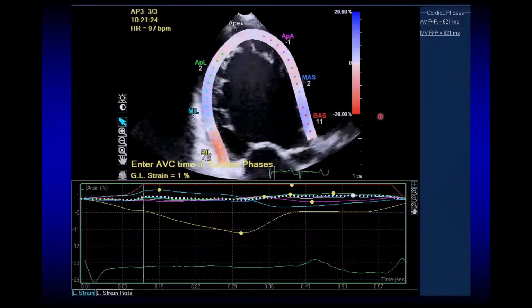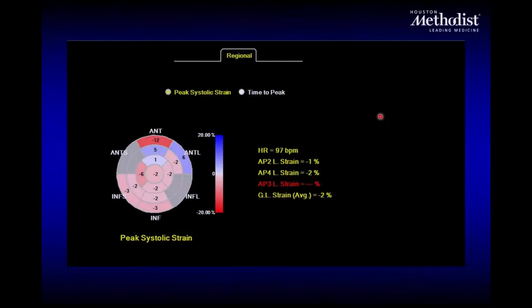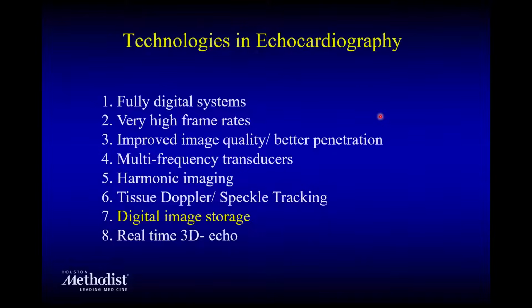And this is a bad heart situation here where ventricular function is really very poor and the global longitudinal strain is very depressed. Normally, usually it's above 18% or so for longitudinal strain. Depressed definitely below 16, and the highest numbers usually about 25 or so percent.